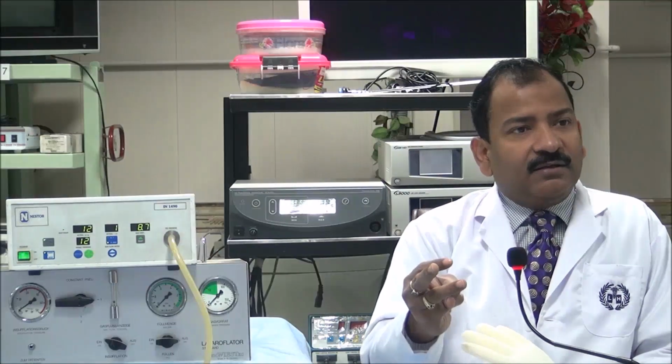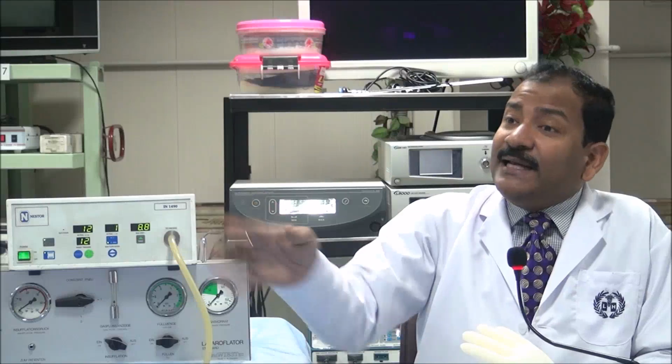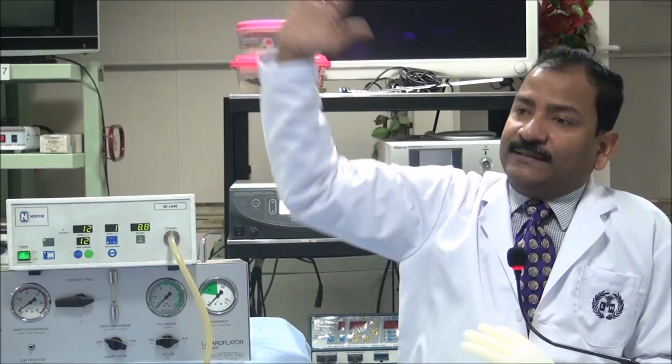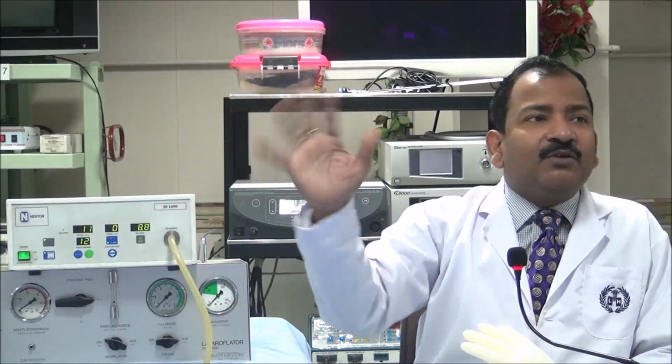But that one you have to adjust for emergency, normal and Veress. So it has 3 modes: low flow, medium flow, high flow. During Veress we will keep low flow, during surgery keep medium flow, and in emergency keep high flow. But remember, high flow, even if you keep it from the beginning, no problem. Because high flow doesn't mean it will flow high. High flow means it is ready for high. Even if you put it to 45 liters per minute and there is no gas leak, the insufflator flow will remain 0. This is very important to keep in mind. You cannot force the insufflator to put in gas.